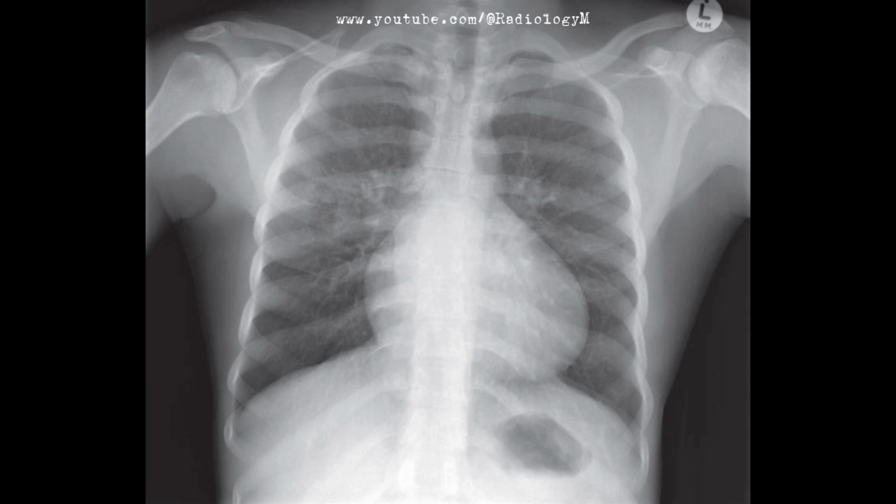The cardiomegaly could be related to chronic anemia, which is a common complication of sickle cell disease, leading to high output heart failure or other cardiomyopathies. While considering the differential diagnosis, I would also keep in mind other causes of these findings. For instance, the skeletal abnormalities could be related to other hemoglobinopathies or conditions like thalassemia. However, the presence of cardiomegaly combined with the skeletal changes makes sickle cell disease the more likely diagnosis.